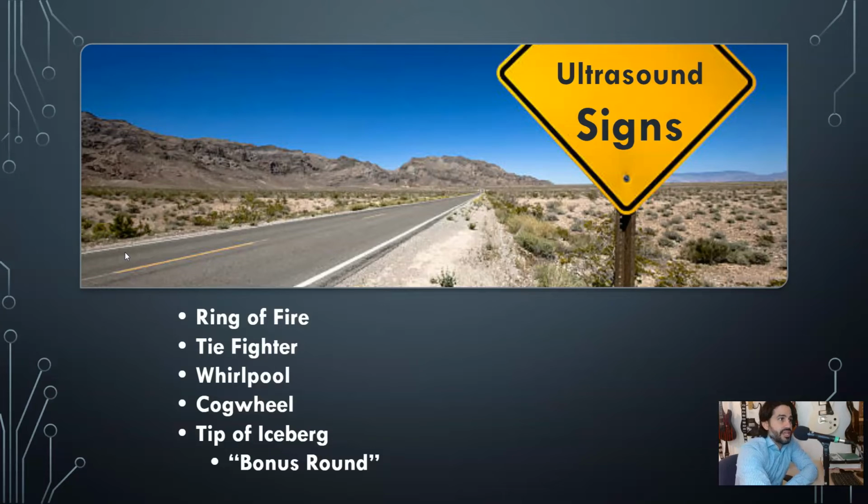All right, so on to the ultrasound signs. We're going to be going over 5 signs. Ring of Fire, which is a famous one everyone knows about.